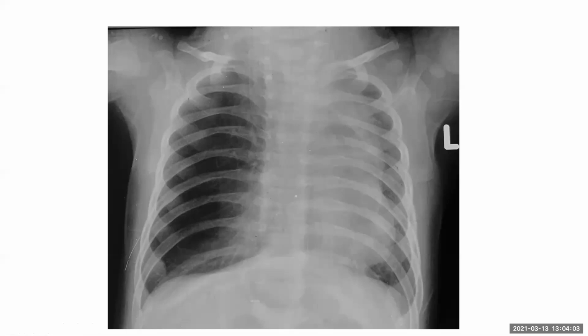Another question is how to differentiate congenital lobar emphysema from foreign body aspiration on X-ray? Good. The ones I've seen, they are usually hyperinflation, because the right main bronchus is more straight and shorter, and usually the foreign body runs into the right main bronchus or the bronchus intermedius. I haven't seen a foreign body going backwards into the upper lobe bronchus.